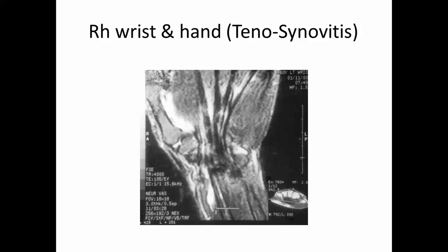And tenosynovitis, like this one, like that one. These are tenosynovitis, means inflammatory reaction of the tendon sheath. So it is similar to that of TB, but of course the bone changes are different and characteristic, affecting the metacarpal and metacarpophalangeal as well as the proximal interphalangeal.